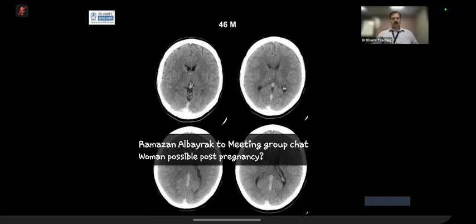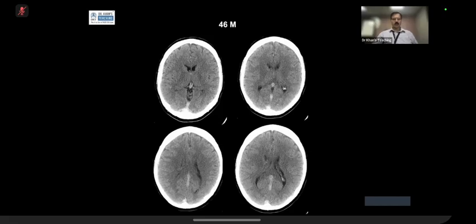I'm showing you a few presentations of dural venous sinus thrombosis, which can come in the exam. And they will show you slightly tricky manifestations, but you have to develop your eyes on that. This is one of the favorites in the exam.